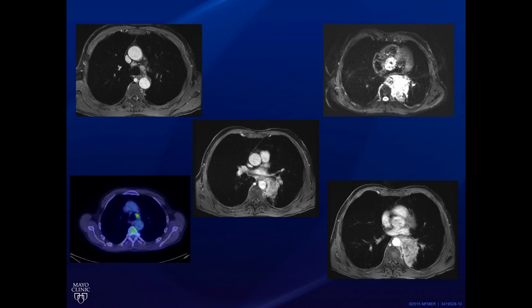So these images, this is a patient who ended up with a lung cancer, left lower lobe. You can see it down here. This is one of the dynamic images, and I'll show you more of that later. But you can see the really nice contrast enhancement through that. I think it really rivals CT. The lungs don't, but the mediastinum really does.